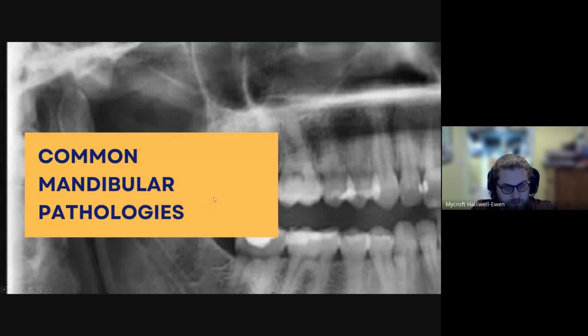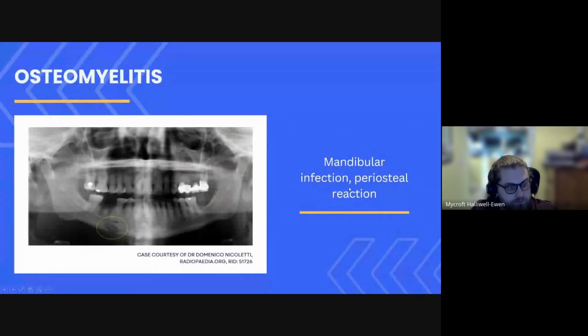So let's have a look at some, shall we? Right. Okay. Got some lucency here. Right. It's given us the diagnosis at the top, so I won't ask, but there are some clues. So this is an OPG, isn't it?